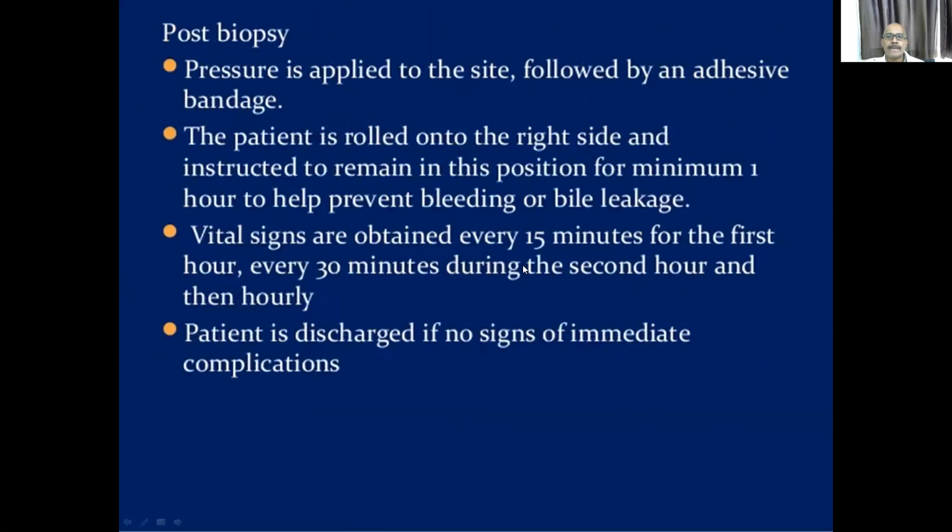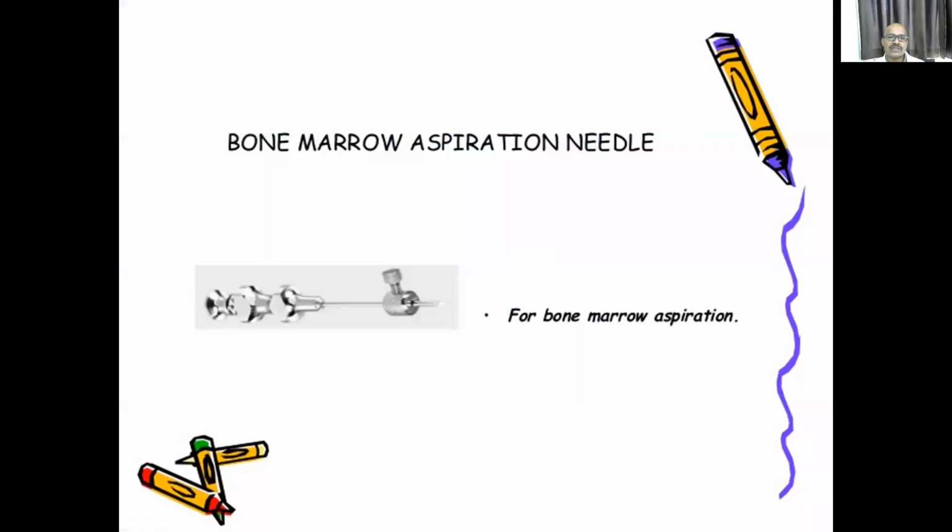And what is this needle? Needle with a guard. So this is a Salah bone marrow aspiration needle. You have to write Salah, S-A-L-A-H, bone marrow aspiration needle.